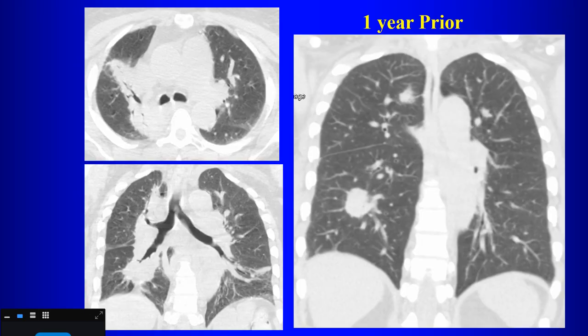And so the CT scan looks like this. This is what it was like before. This is why it's got this funny looking field. She had 2 tumors, and they treated all of it with radiation. And so we're looking at all of this post-radiation change. That sharp demarcation between the uninvolved lung and the involved lung is always a clue that patients had radiation therapy.